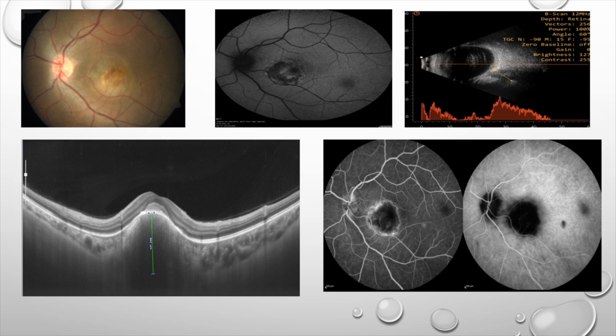Now we stop here. The most important thing, why this case is being presented, the reason is, I'm sure most of you must have got the clue what the diagnosis is. So can anybody tell what the diagnosis is now? There is a raised lesion. We all know that it is arising from the choroid because the OCT is very clear that it is from the choroid. So now this is a pigmented lesion, from the choroid.